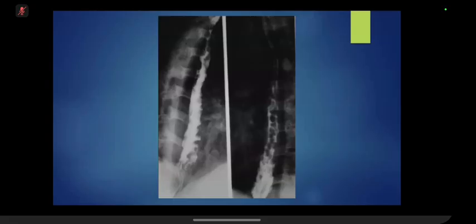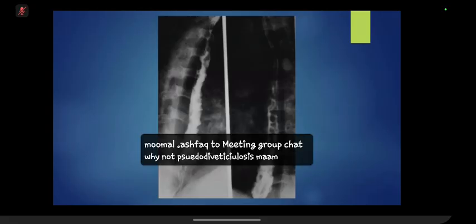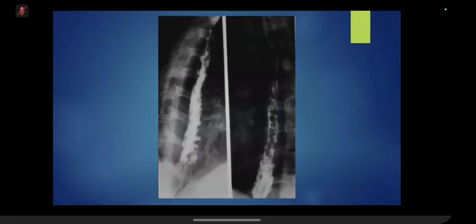Now, as the patient is of old age, what would you like to exclude in this scenario? I'd like to exclude cirrhosis in this patient. You will go to the history, you will ask the patient if there is any previous history or anything else, 56-year-old, based on the imaging findings. Any history of hematemesis for which the patient might need intervention in the form of ligation or sclerotherapy or banding.